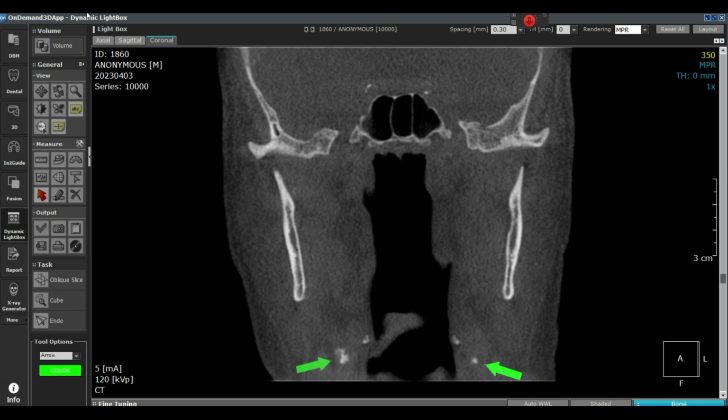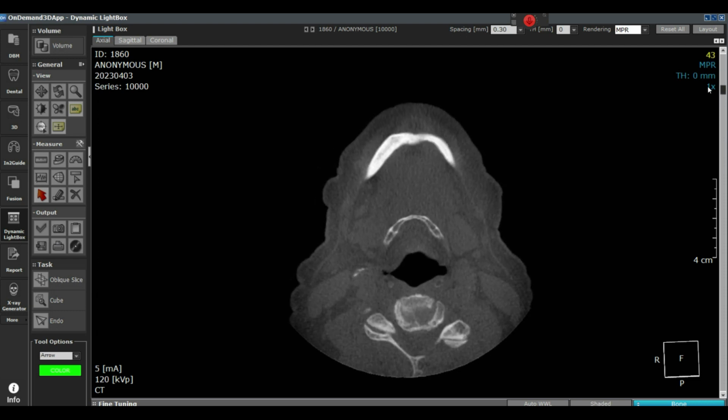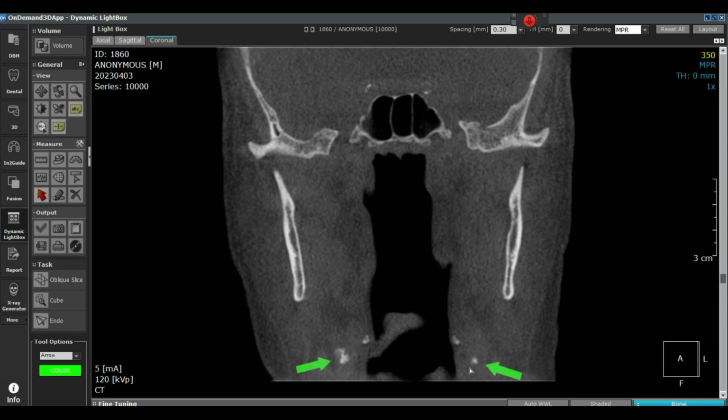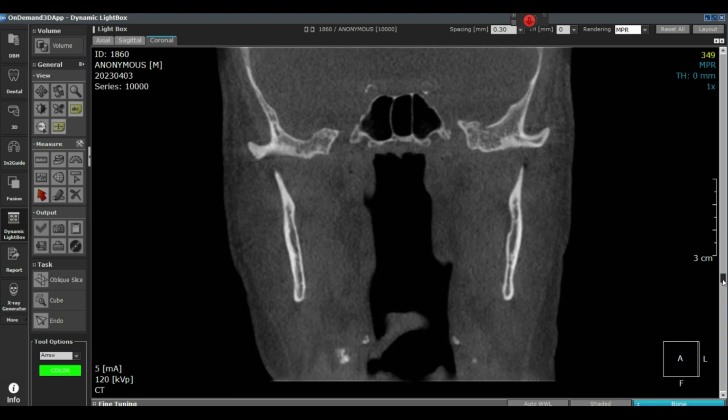When in actual fact, if we first go into the axial plane of section and find those calcifications, you'll see that the one on the left side right here is actually quite circular. Even just doing our MIP tool and thickening this slice out would show you what you're really looking at. So we'll go back to the coronal plane of section, and you can see that these calcifications, this one's a little bit bigger now, still look rather, quote, plaque-like, or calcified.